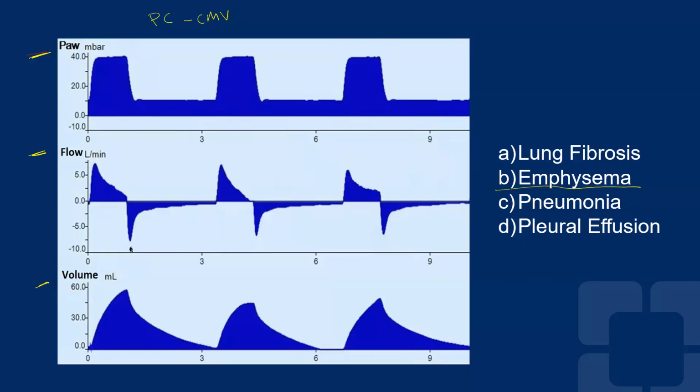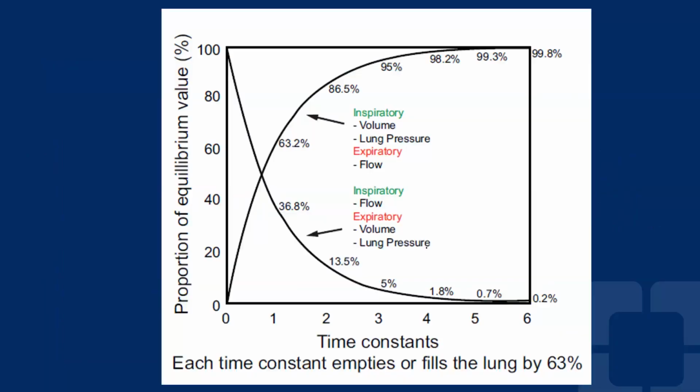Here in this waveform, you will see that the time, instead of reaching baseline as fast as it should, this dotted green line is the time the flow gets to baseline. And you see in this model, in which there is increased resistance, it's not reaching baseline in the time that we said. So simply by standing in front of the ventilator without doing any maneuver, if you don't see it returning to baseline with this exponential decay, meaning it's passive, this means that the resistance is increased.